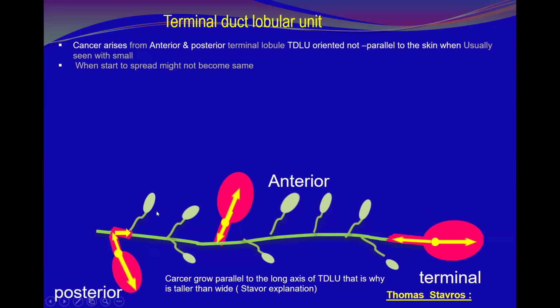Do you remember this image or these illustrations from before, when we described the anterior and posterior terminal TDLUs, and why the cancer is seen as parallel and non-parallel? Do you remember that discussion? Yes.